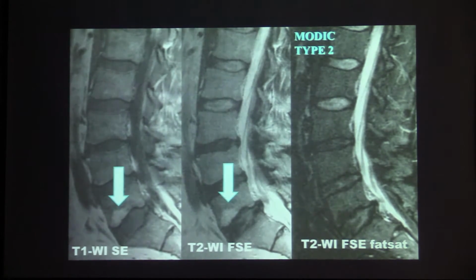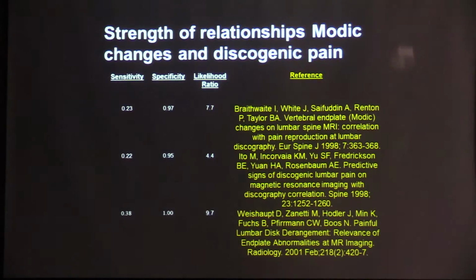So that's why it's similar to the subcutaneous or retroperitoneal fat. And so type 2 is kind of that second stage after the edema resolves, and some people feel the edema is related to an instability phase in the disc or fatigue failure. You get this reparative phase. This is also associated with pain. So type 1 and type 2 changes of this size are associated with pain.